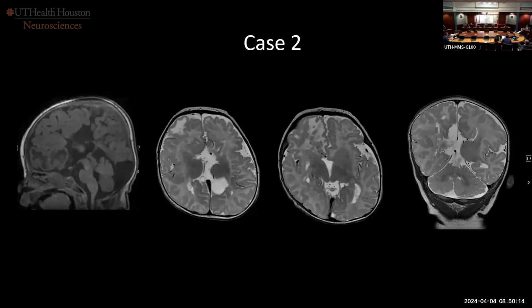This one is the toughest of them. Many things, right? Just name them. So you just look at the bullhorn, right? What is it? This is corpus callosum dysgenesis. And I told you the two things associated with callosal dysgenesis you have to look for.